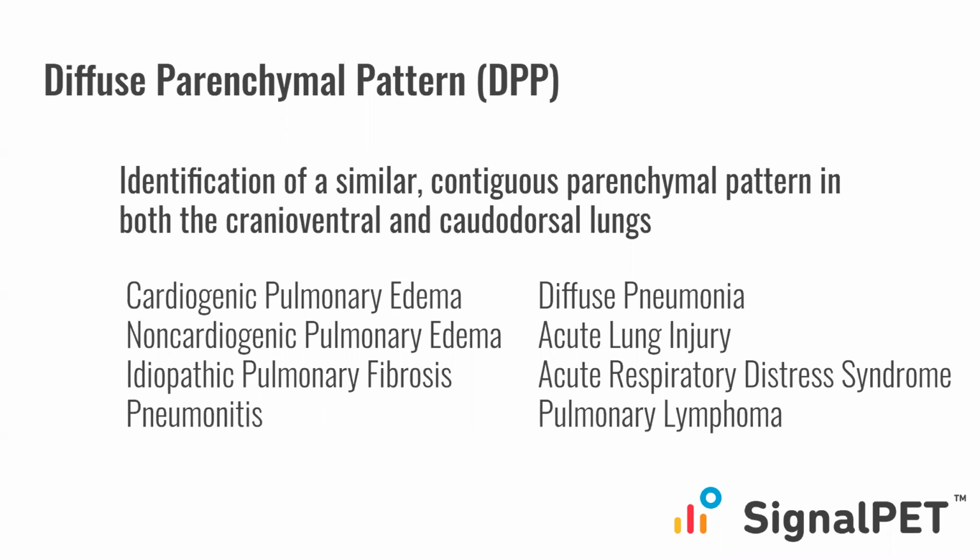I have to say, as a radiologist, this particular pattern is probably the bane of my existence, just because it can be so challenging to diagnose, even if we do have history and everything. One of the reasons is that the differential list for this is so incredibly long.